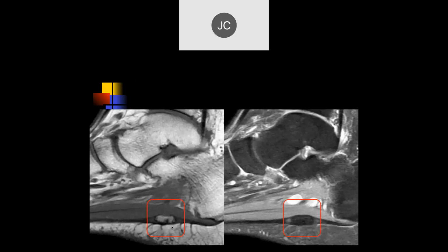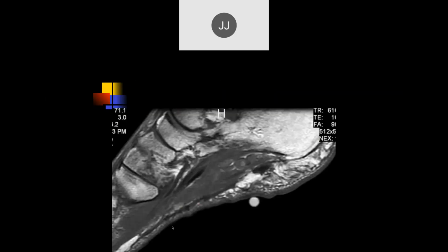It's due to trauma of some kind or another. Maybe I just got a contusion of the area and some bleeding, and all of a sudden the calcium starts to form. Yeah. Okay. Robert, what do you think of this case?